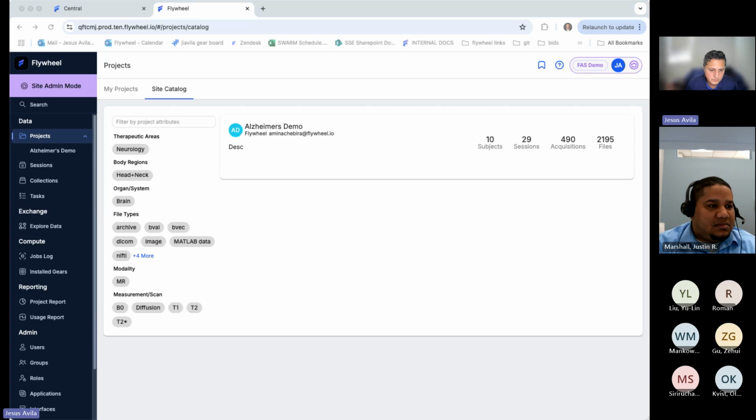Okay, perfect. Final words: hopefully you now have a way to view and get your data in, start playing with the UI, and run your curation pipelines. You understand how to use tags and run these automatic pipelines, and once you have your data curated, you can share it with the different sharing methods we have available, whether exporting it outside of Flywheel or smart copying a project and things like that.